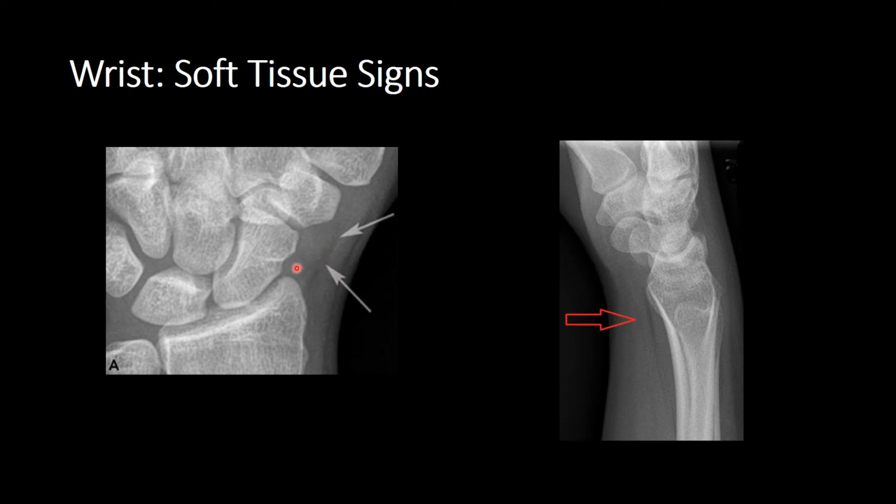and this dark grey stripe that lies just lateral to the scaphoid is the scaphoid fat stripe. Now it's important to be aware of it so that you can recognise it. The only problem with the scaphoid fat stripe is that it's not terribly sensitive, because unfortunately in a significant number of individuals you can't actually visualise it. It's something to be aware of, and if you can't see it, that may indicate that there might possibly be an underlying bony abnormality. But remember, not all patients have one visible, so it's not that sensitive.